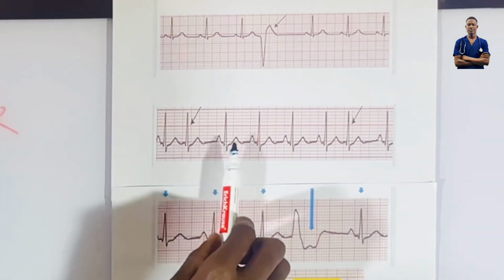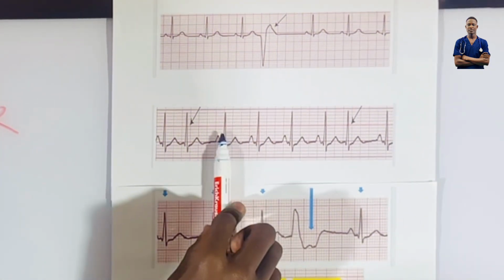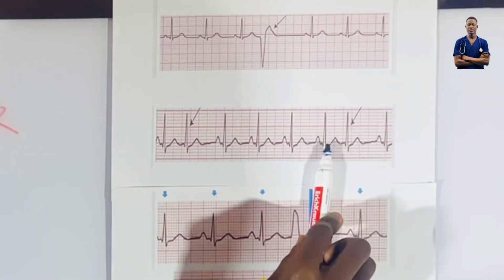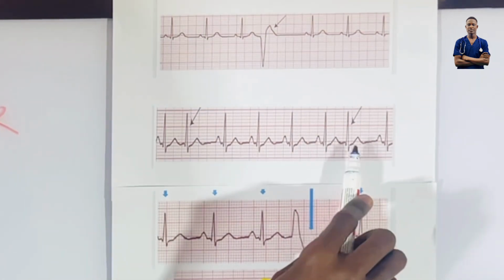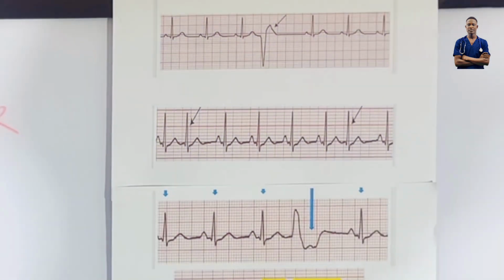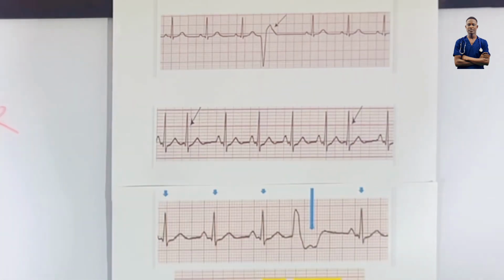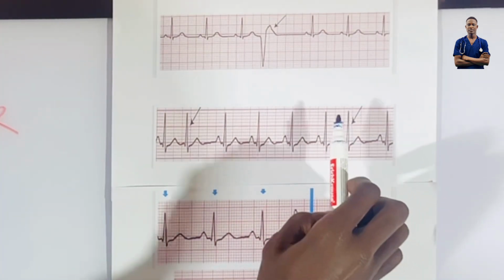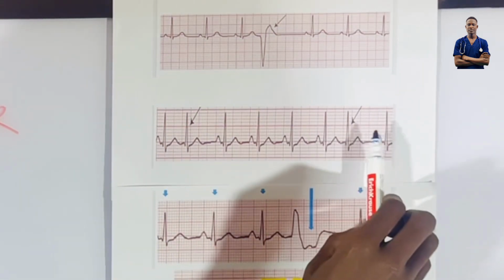So this, we check the normal one, this and that. The distance between this and that, and this and that, is the same. You see there's regularity. But when the distance between this and that drops, the distance has been dropped. And then after that, the early contraction, there's a very large distance between that one and this.